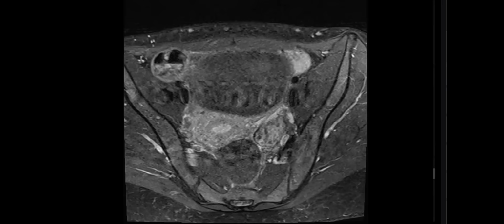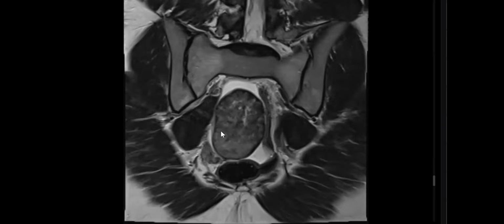Okay, so the first category of cases, acute pelvic pain due to ovarian torsion. One friend said, Dr. Ismail, maybe fibroma. Okay, fibroma, yes, diffuse low signal on T1 and T2, but it replaced the ovary. Here, the ovary is still present, the stroma is still present. We have also some follicles. And remember, acute pelvic pain. So this is a hemorrhagic infarction involving the ovary, not a low signal mass.